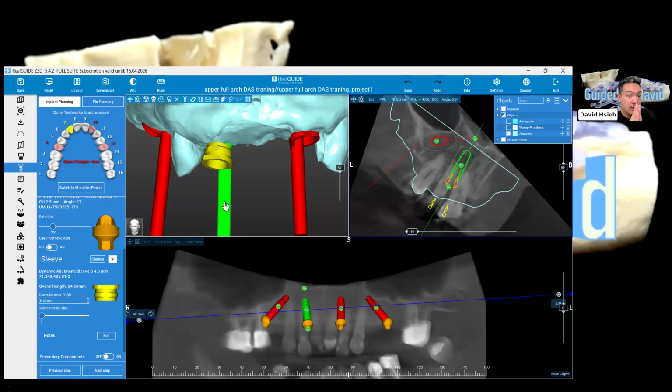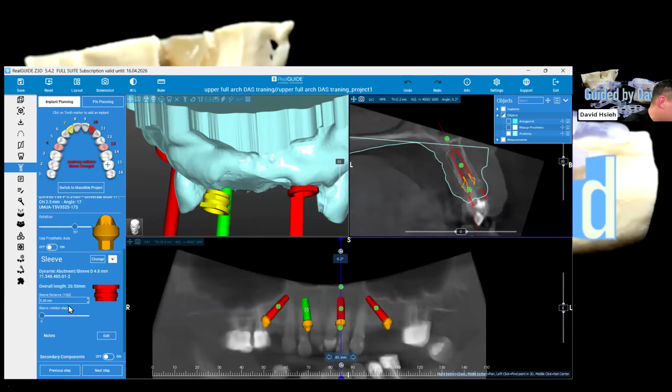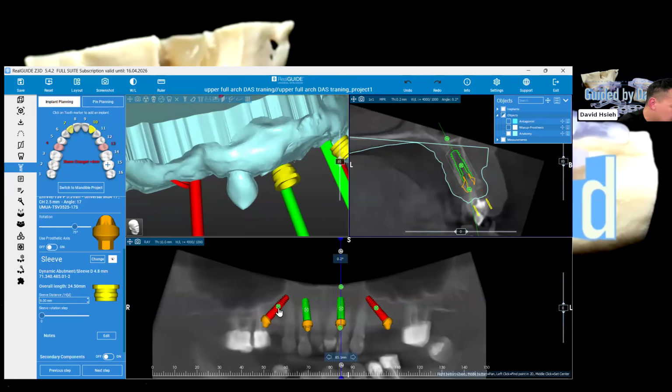And when you do the implant delivery, you just use a different offset height. There will be a different height of implant mount. So even though the sleeve has been raised, when you drive the implant into the guide, the implant will still stop at the exact position where it should be. That's amazing, right? So much freedom. As a surgical planner, I love this feature. So that just raised it from 5 to 9. Usually I would use the same prolongation, just easier for the surgeon to do the surgery.